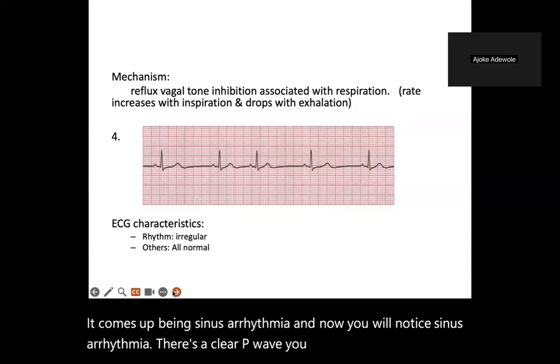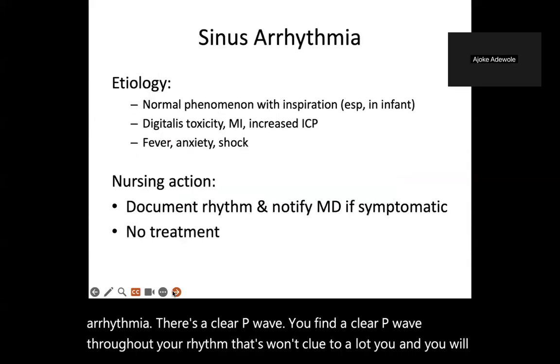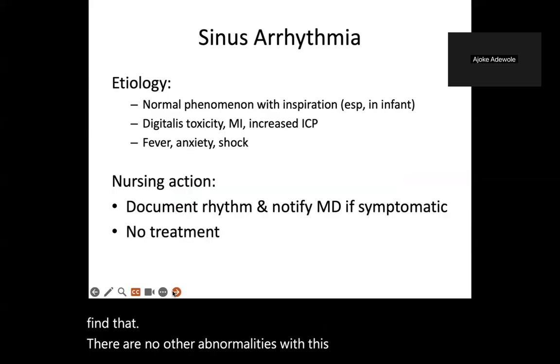You find a clear P wave throughout your rhythm. That's one clue to alert you. And you will find that there are no other abnormalities with this patient. This patient is most likely having a normal heart rate.